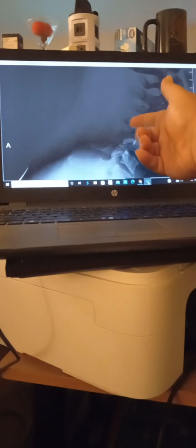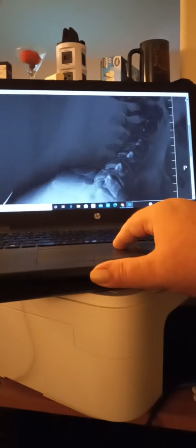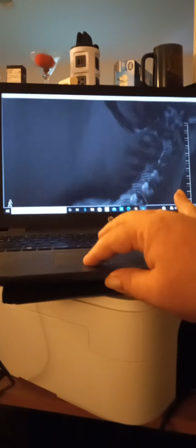So this one here is even. These two are supposed to be, I mean, it dips down real low and then goes back up. That's what I'm saying. And is this normal? So there's a hole here, and you can kind of see that. What does that mean?